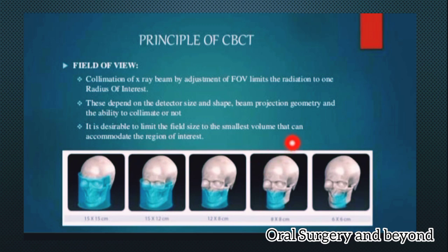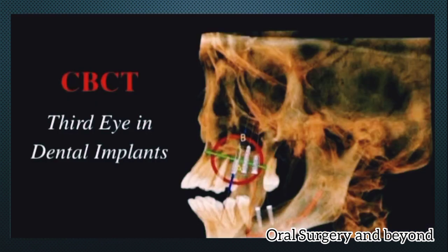So this is the field of view part of the CBCT. Let's see how the CBCT works in different pathology and for the clinical implications.